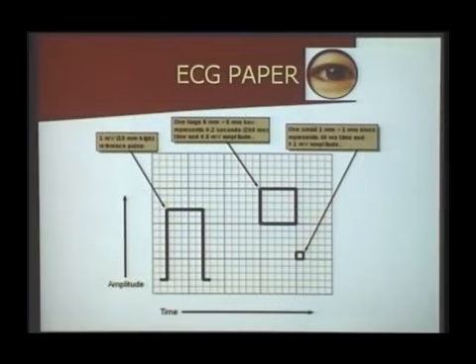You have to make sure the ECG is recorded in 1 millivolt standardization. 1 millivolt standardization is nothing but this vertical bar will have 10 small squares. Each one of your big squares will have 5 small squares horizontally and 5 small squares vertically, and your 1 millivolt standardization should include either 10 small squares or 2 big squares. So, this is your 1 millivolt standardization, and the ECG speed of recording is 25 millimeters per second.